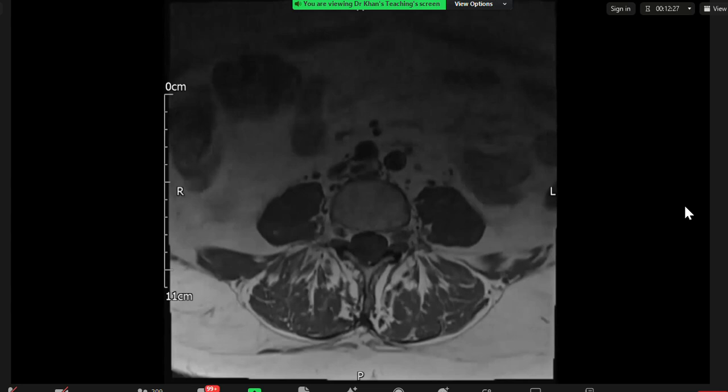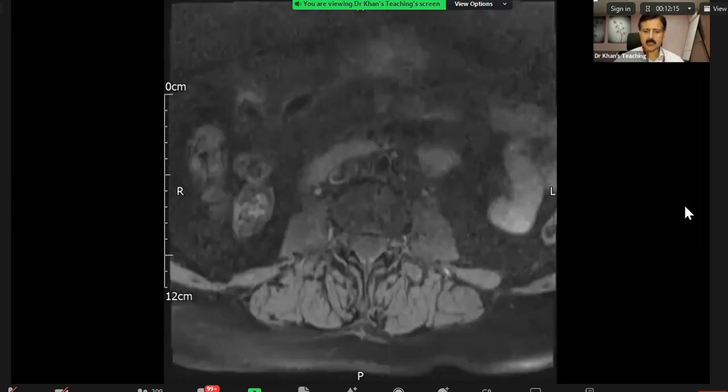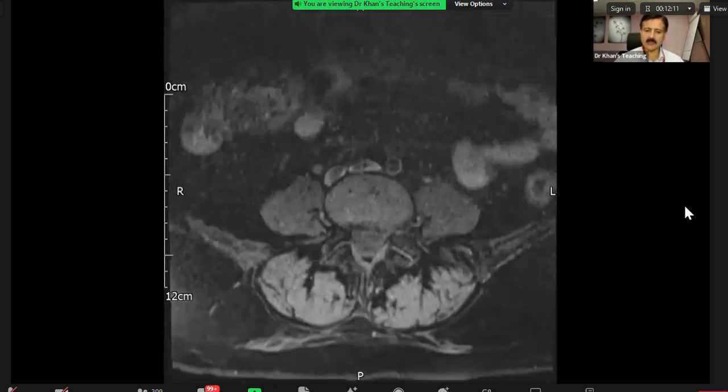So I think the lesions again seen. Can you hear me? Yes, I can hear you. I don't want you to describe the sequence. Please go to the next series. Okay. And this was a pre-contrast. Please go to the next series. Okay.